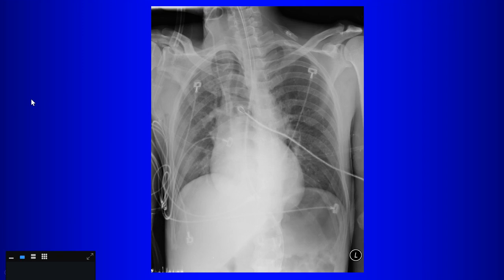Okay, so on this chest radiograph, anything important that we need to mention? Oh, is that a fracture? Where? The right clavicle? I can't see that. Well, here's the distal clavicle over here. There's the acromion, so the acromioclavicular joint is in the right place. Nobody has anything to say?